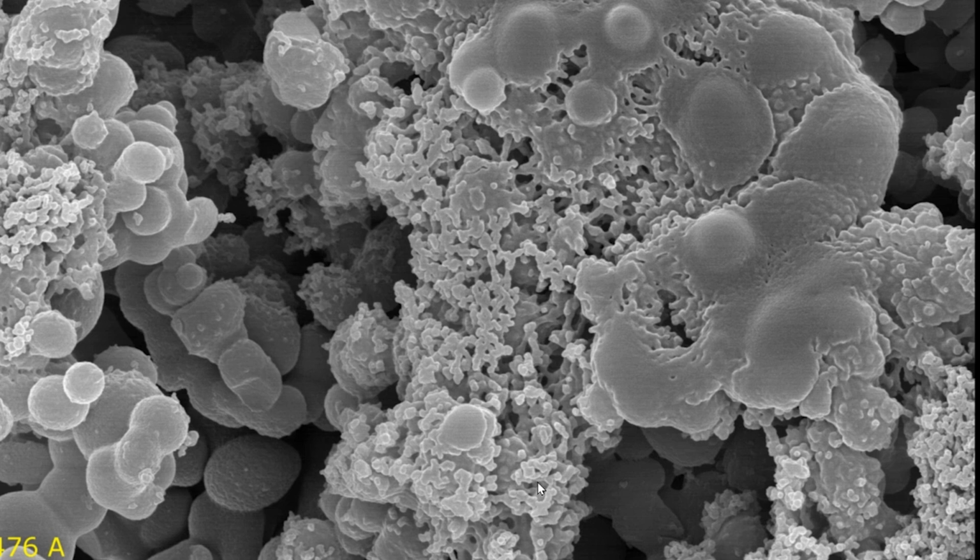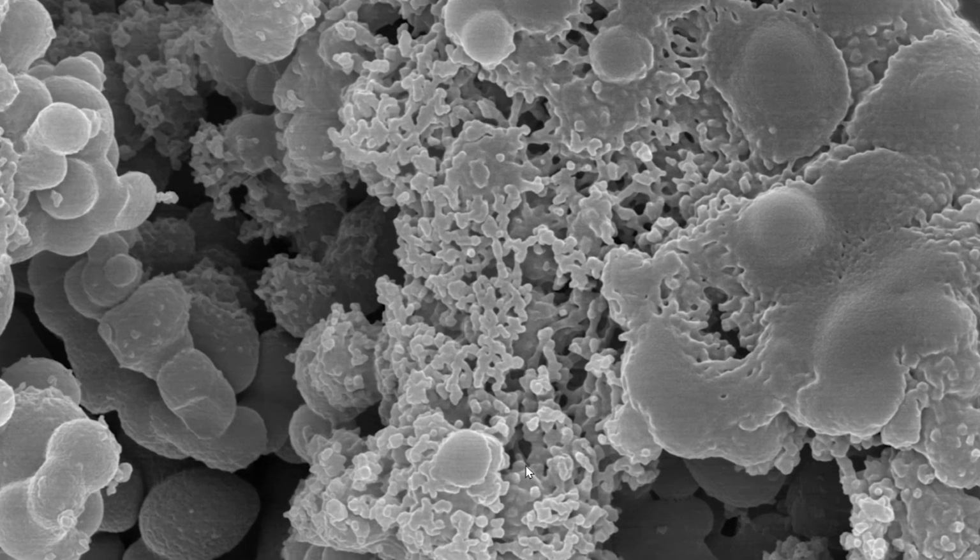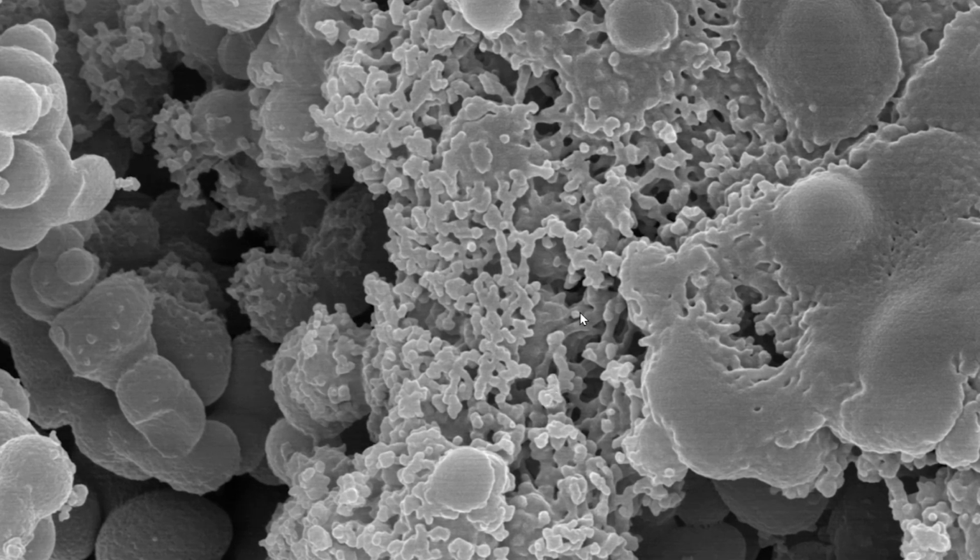And to me, it looks like a very mature, old, ancient biofilm. Here you can see these little vesicles coming off of the fungi. And it's known that these vesicles actually supply the EPS that allows the fungi to bury themselves in this extra polymeric substance and be completely resistant to chemical or drug attacks against it.